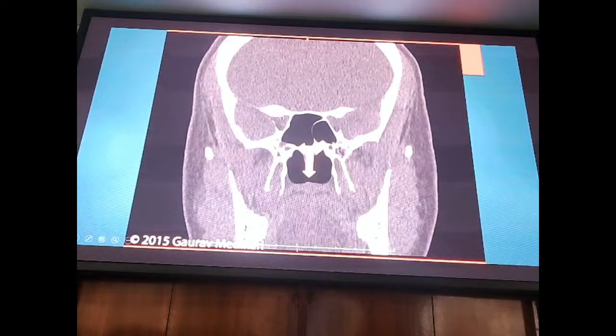You can see two black structures here. What are these two black structures? The one which is medial, which is in the base of the pterygoid, is actually the vidian nerve. If you trace it backwards, it will take you to the foramen lacerum segment of the ICA. And the second one you are seeing here is the V2 segment of the trigeminal nerve, which, if you trace the infraorbital nerve, it will become the V2 segment of the trigeminal.